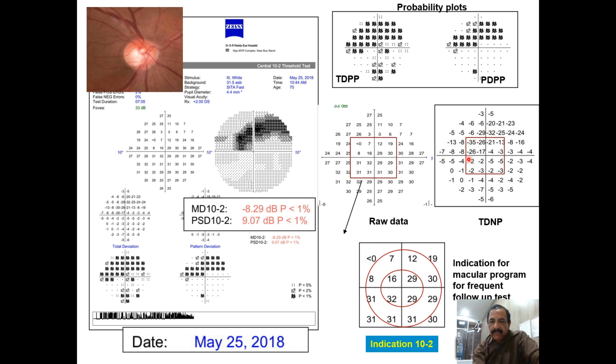And if you observe, the disease process is progressing towards fixation. So you should be very alert. Since the IOP is only 15, these are all normal tension cases. Most glaucomas start within 10 degrees. Most of them are normal tension glaucomas.